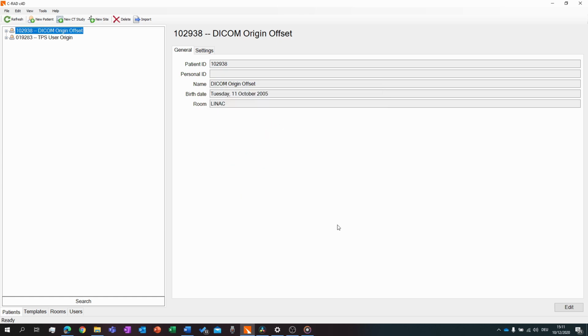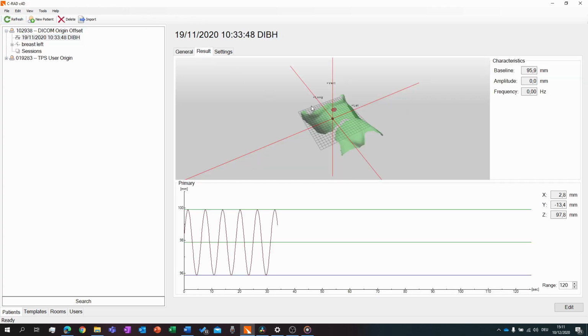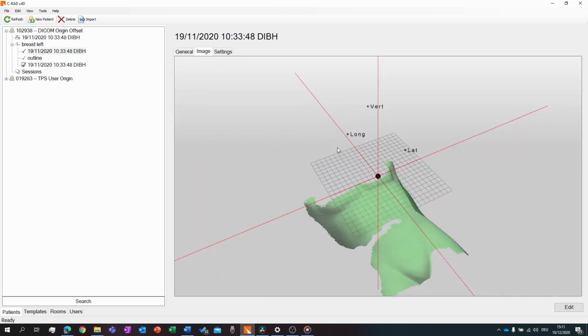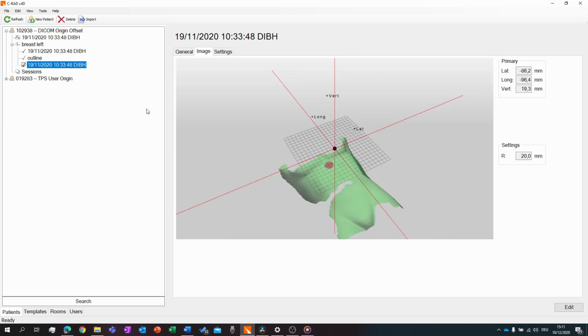The effect for both options is that the Sentinel surface will be shifted by the offsets you import. So here we are doing our magic transformation basically. This is very important for gating, so that the gating spot is transferred correctly by the offsets, or in other words, remains on the same position where you had it during the CT procedure, but in relation to the newly imported isocenter from the treatment plan.